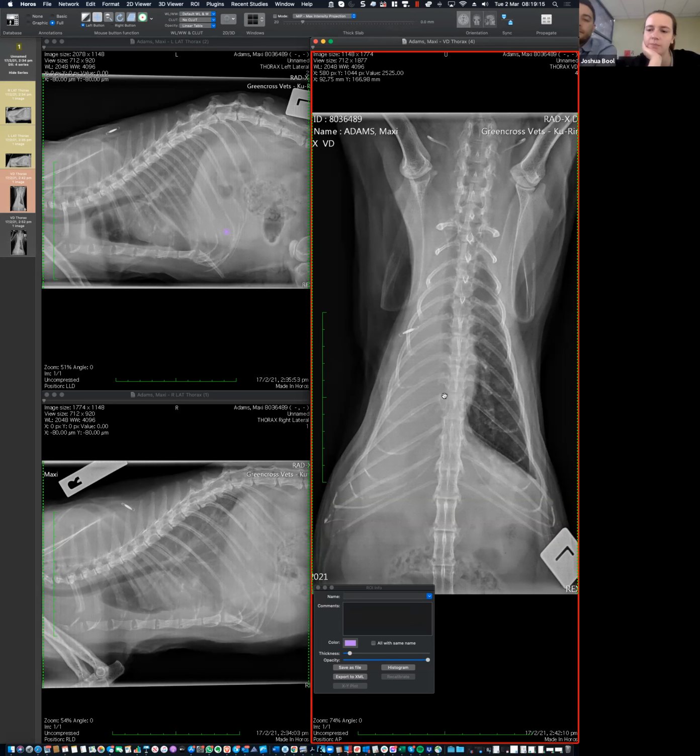So off that same train of thought, Mariano, if complete atelectasis or collapse is unlikely, but with the whole grapes thing that you taught us, that if air and fluid were at the same level, you would be able to see a lot more defined structures. Does that make it more likely that whatever this is, whether it's an effusion or not, is actually in the lung? Because if we expected some air in the lung, we'd be able to see some kind of air compared to fluid border. Exactly. So I like that.